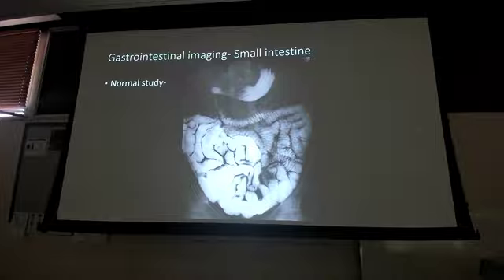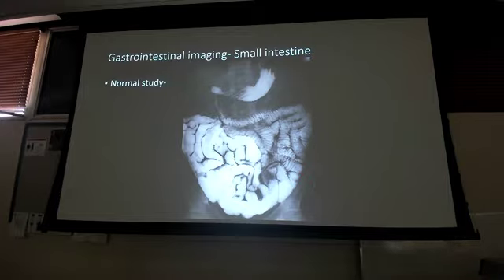And then as the barium goes through, we get a little bit thinner up here because it's being pushed through, it's being peristalsed through. This is the final picture of a small bowel follow-through. How much information am I getting out of this? Not a ton by itself. It's kind of hard to evaluate what's going on, which is why there are multiple pictures as they march through this.